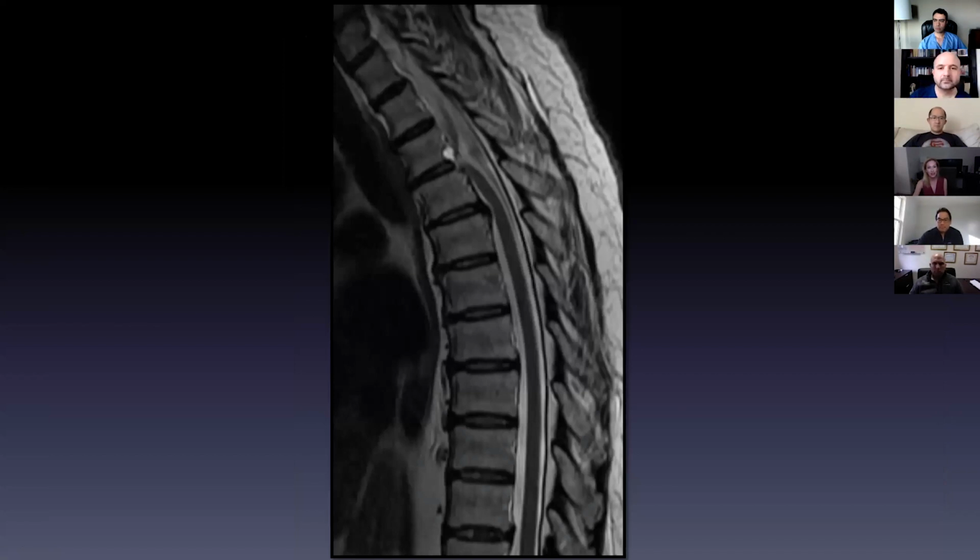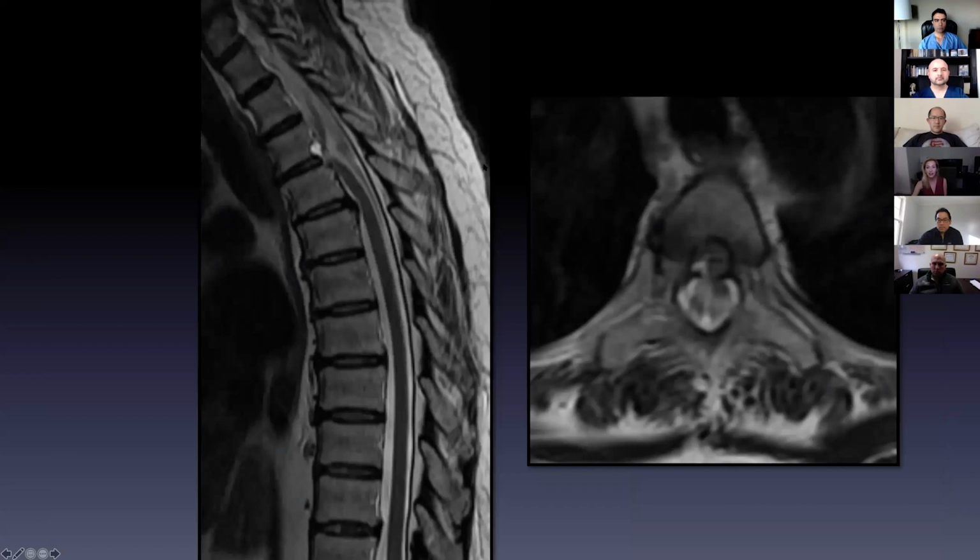This one you wouldn't mistake for anything else. So cord, sagittal T2, cord coming forward, markedly narrowed, fast, gray flow artifact. There shouldn't be anything here but CSF, so we know that's flow artifact. Here's the axial, cord herniation, actually so much pulsation and deformation that it's going into the bone. So this one, no one would mistake.